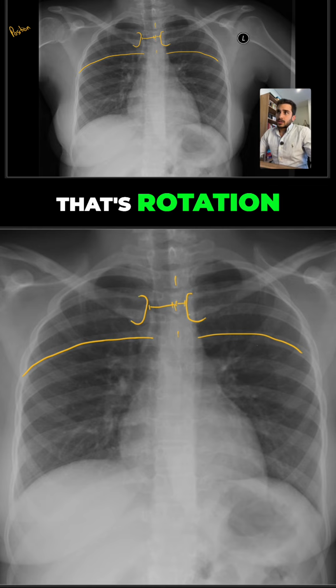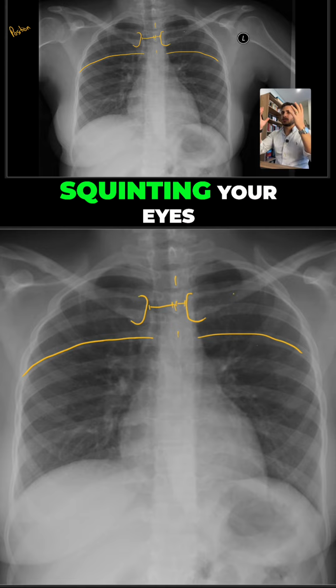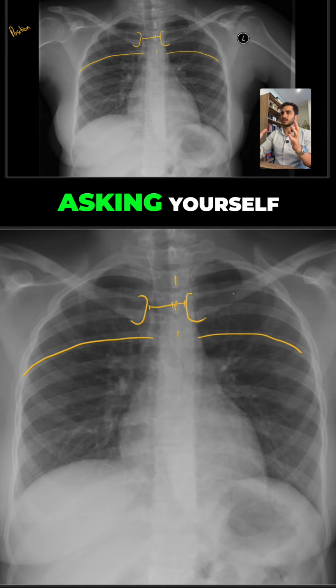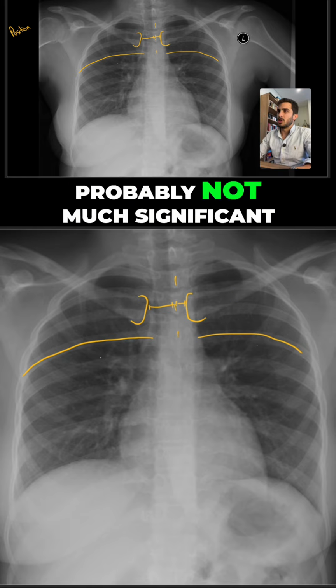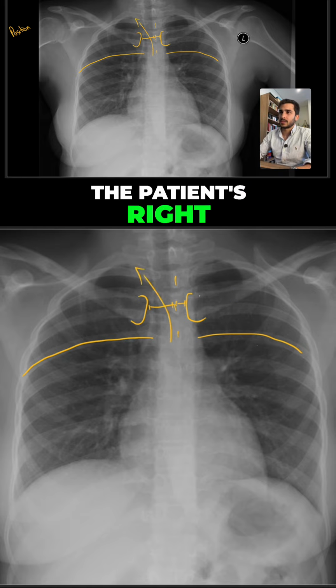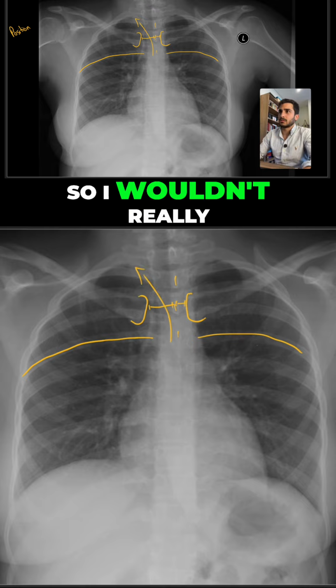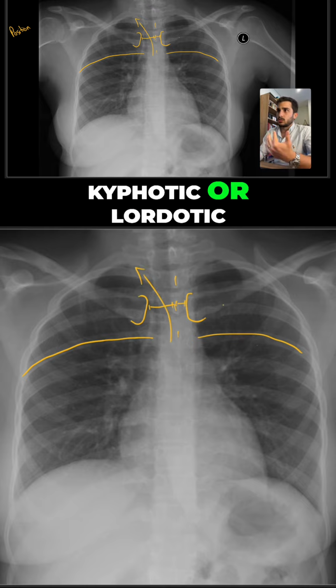Now, that's rotation. Is the patient tilted? So again, kind of zooming out, squinting your eyes a little bit, asking yourself, are the lungs tilted left or right? Probably not much significant, if anything, very slightly towards the patient's right, but it's very minor, so I wouldn't really worry about that one. The other question is if the patient is really kyphotic or lordotic.